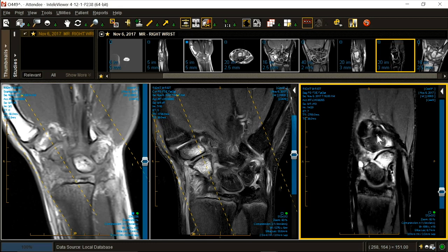I mean, at 6 to 8 weeks in a young person, don't you think you'd have some bridging? Now, it's too early. What's the cutoff for absolute non-union? 16 weeks. When should you have bridging? 8 weeks. I told you my son bridged a displaced clavicular fracture in 3.5 weeks. So I already know that the odds of this coming back together are low. It's going to end up as a fibrous malunion or as a non-union.